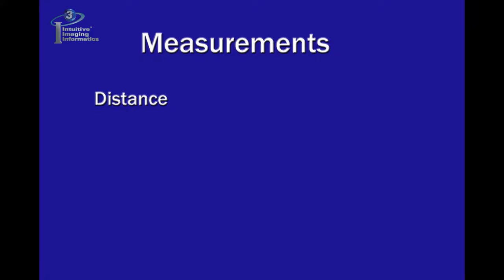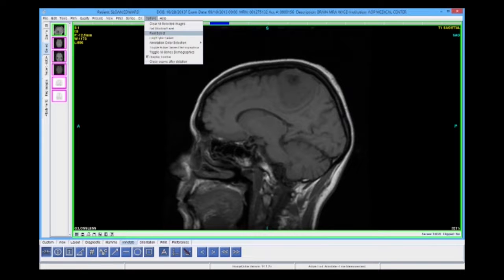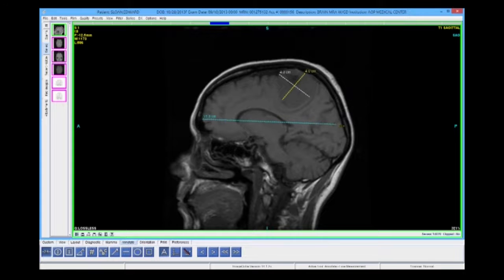Measurement tools may either be displayed in a selected color, in this example yellow, or the user may select to choose between a rolling set of colors based on their preference. The initial measurement may be in white, followed by yellow, then by turquoise, then red.